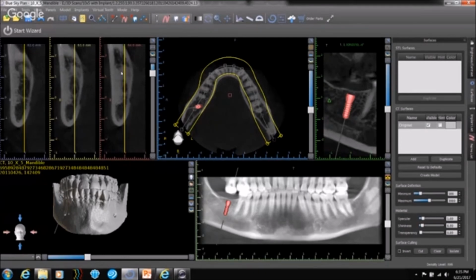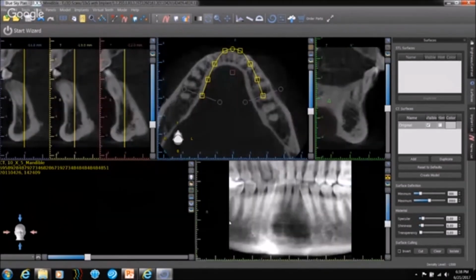Nothing critical, because one of the easiest ways to judge that is you don't see any expansion in the buccal. If it was pathology, you'd probably see some expansion in the buccolingual dimension. You don't see anything. It is a little bit further away too, in fact. So nowhere near the implant area. But the reason I show that is because this can happen anywhere in the mandible. Anyway, a few things to note when it comes to this.